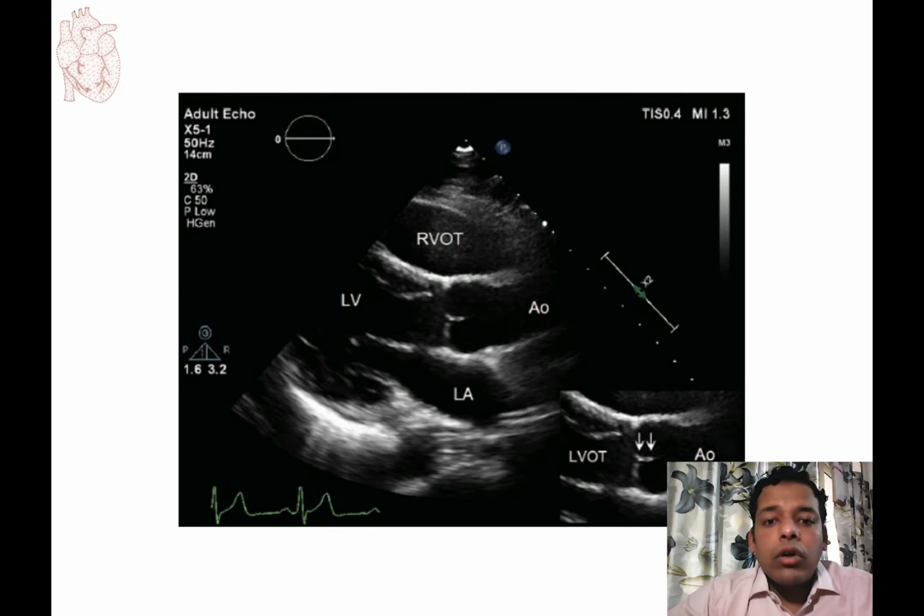The aortic annulus is defined as the junction of the proximal ascending aorta with the left ventricular outflow tract. It is part of the fibrous skeleton of the heart and is contiguous with the anterior mitral leaflet and the perimembranous septum. It is relatively resistant to dilation and can be used to index the remaining aortic sizes.